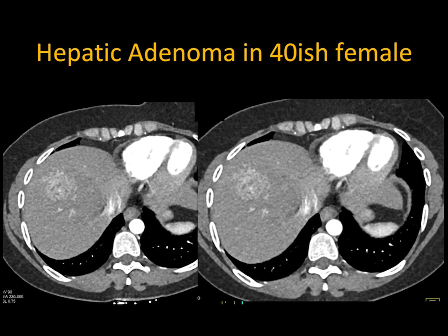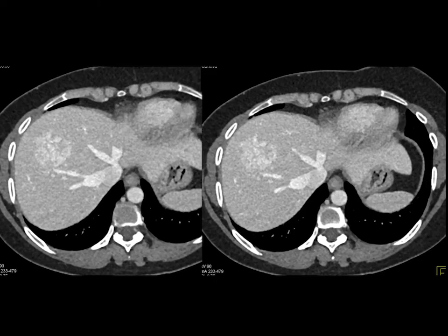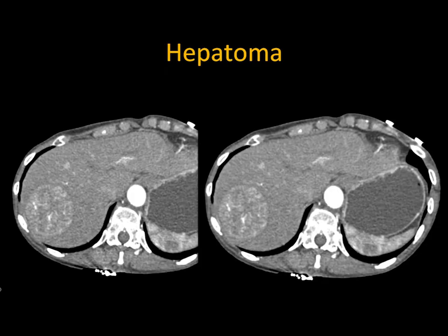We talk about other incidental lesions, hepatic adenomas. Often hepatic adenoma versus FNH is a challenge. Hepatic adenomas are important because they're not benign. They're considered pre-malignant. They also can spontaneously bleed. Hepatic adenomas can look very similar to hepatomas, like this case. It has a pseudocapsule, has what looks like neovascularity. Here's a hepatoma just to compare it to. Doesn't look that different, just a bit smaller.